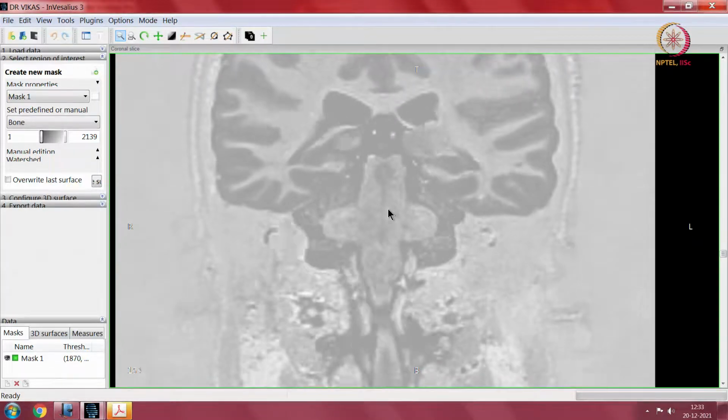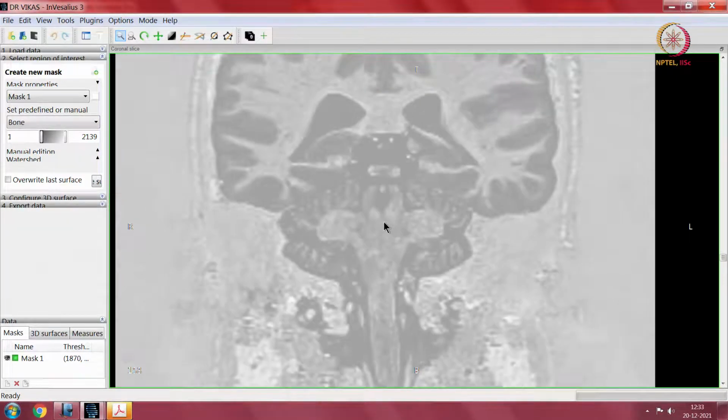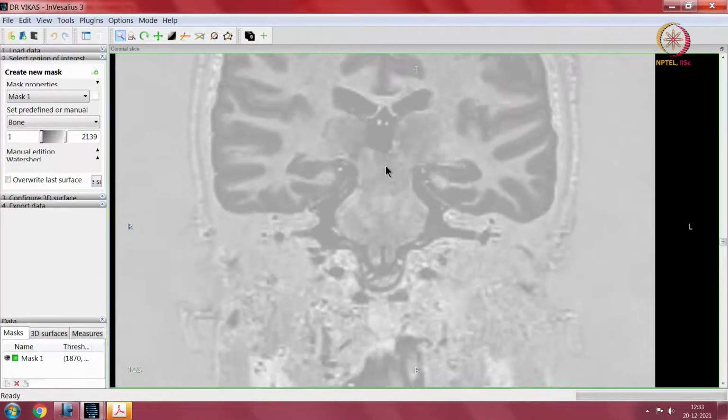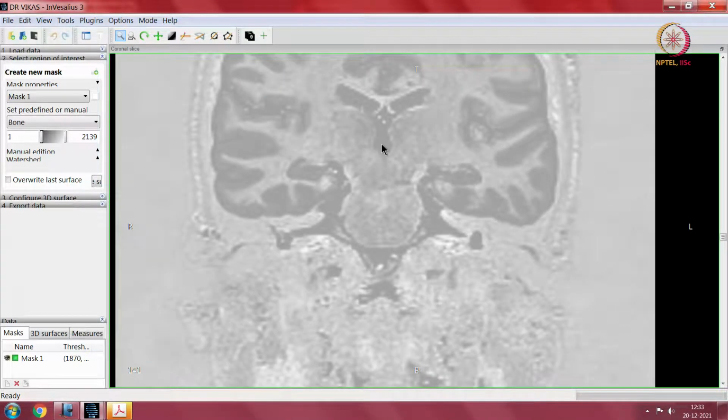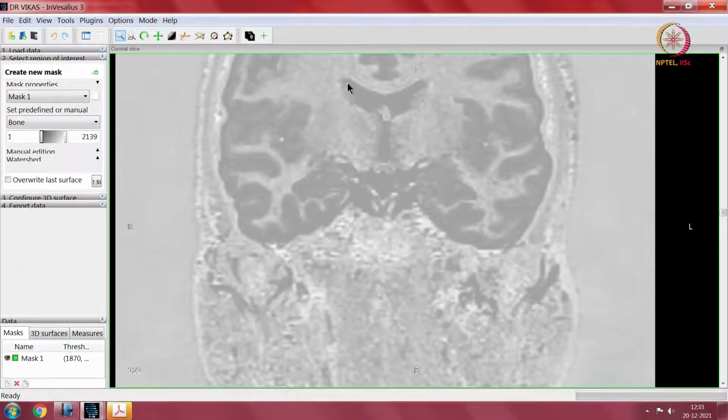So, fourth ventricle is this black space. So, black space, not very clear on the axial imaging, but here you can make out that it is a distinct cavity, and the very distinct cavity continues up to the aqueduct. So, the aqueduct and then continues into the third ventricle, and then through the third ventricle it goes into the lateral ventricle.